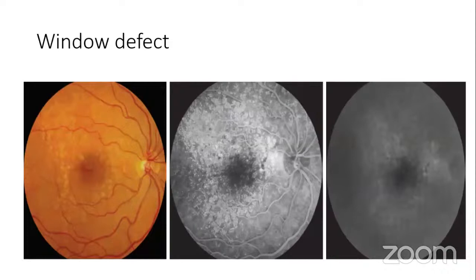So this is what we have here. This is a typical picture presentation in patients with ARMD and drusen. Okay, this patient has drusen all over the place. And remember that one of the major, classical features of ARMD is RPE changes. If you don't have RPE changes and you have just drusen, you start thinking of a differential. It may not be ARMD. Drusen is part of it, but drusen alone does not define ARMD. It's not the only thing.